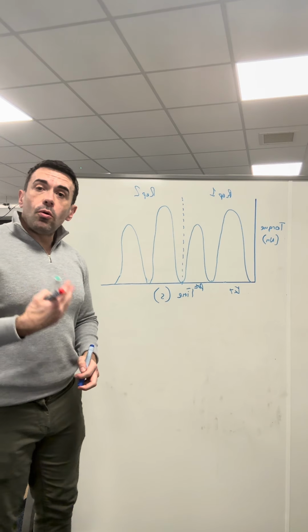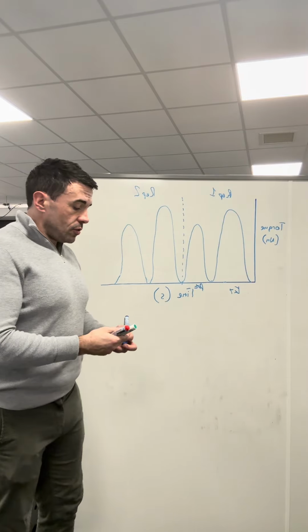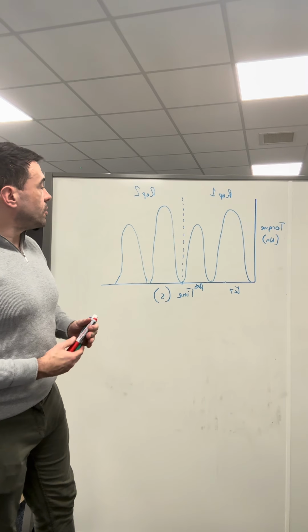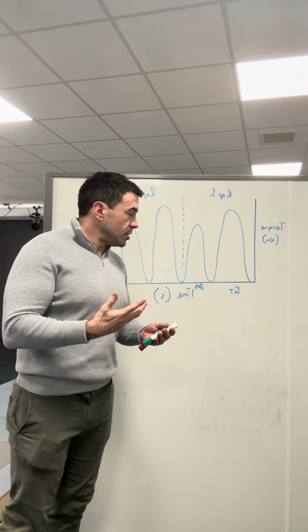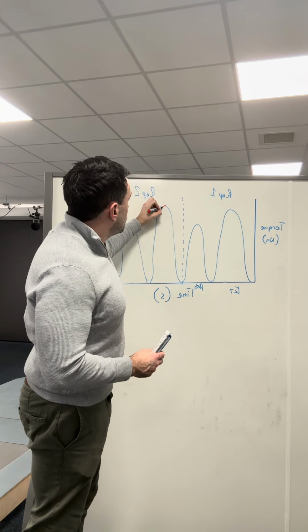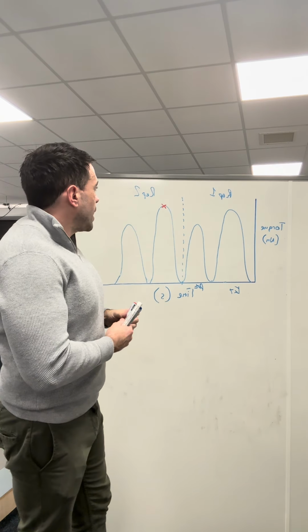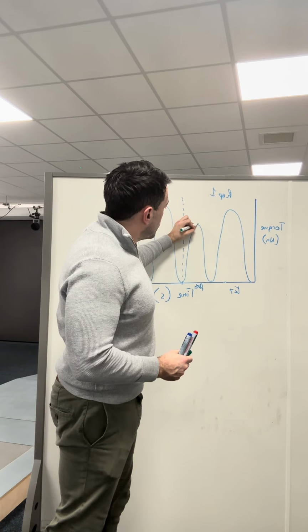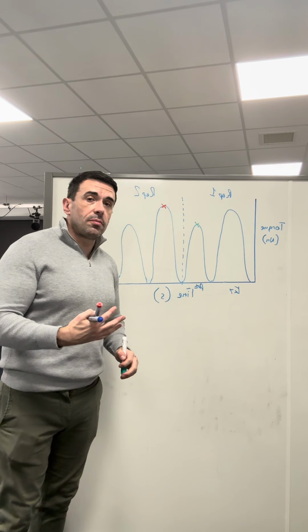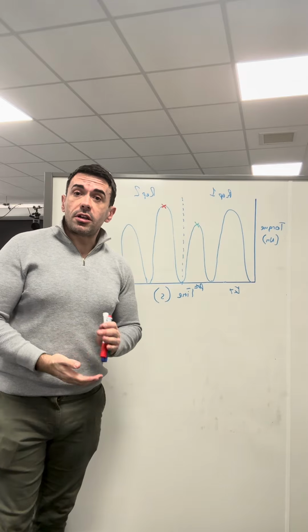One of the most important measurements that we can get from isokinetics is peak torque. Peak torque for each flexion and extension repetition basically takes the highest value. In this case, the peak torque of the quadriceps would be this value here, and the peak torque of the hamstrings would be whatever this value is here. Now, this is a widely reported measurement, and it is useful because it's used in a lot of other measurements that are used on an isokinetic report.